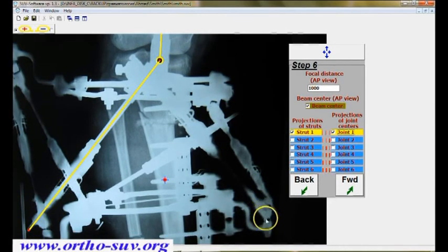Then we click the box joint number 1 and align the small shoulder of the joint with the middle axis of the bolt, and the intersection of the strut's line and bolt's line is the joint of the strut, even when we don't see the strut joints properly.